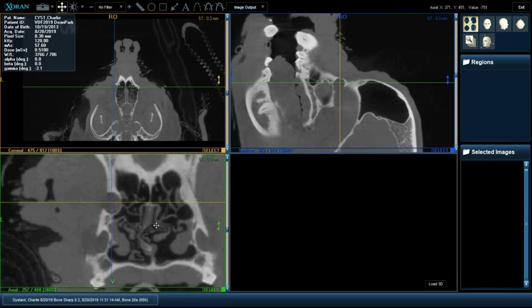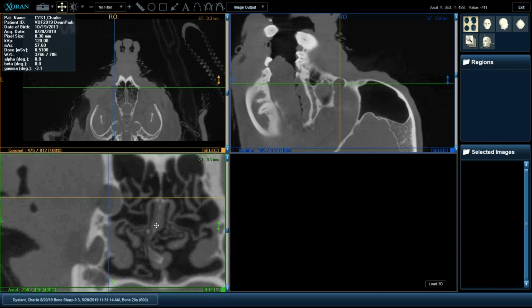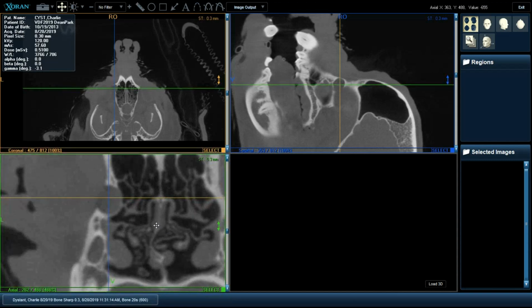To me, it's an obvious cyst for many reasons. One of them is it's not invasive at all, like we saw earlier. It is displacing the bone, but it's otherwise this very clear balloon-looking lesion with nice cortical bone. It's not bubbly or destructive on the surface. So I'm looking at a typical cystic lesion with well-defined borders.